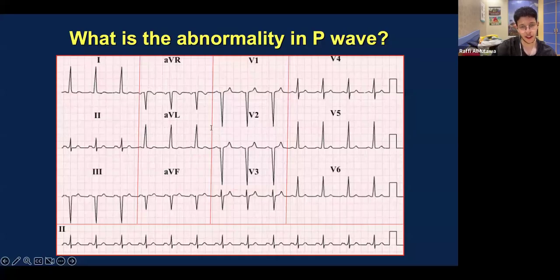Okay, so you guys saw the camel in aVF, exactly. Camel in aVF. So yeah, 2 and aVF, and then V1, V2, V3, V4, V5, and V6. So these two are for the atria, and these six for the ventricles. So as you guys see, there's a camel over here.